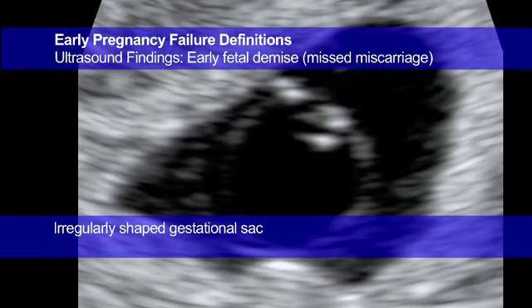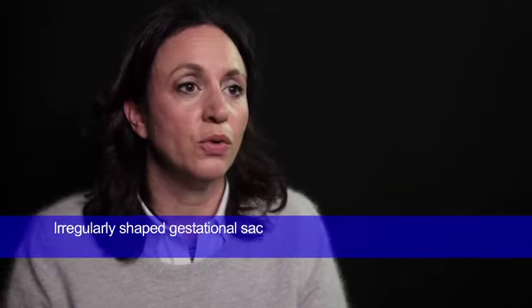We can see an irregularly shaped gestational sac, which is very indicative of a failing pregnancy. Sometimes we see no embryo or yolk sac in a gestational sac of more than 20 millimeters in diameter. This is strongly suggestive of early fetal demise.